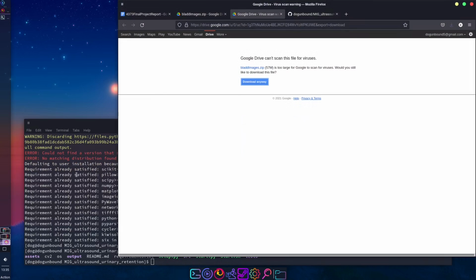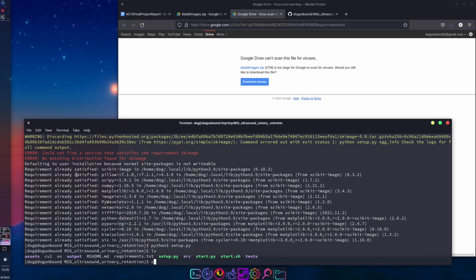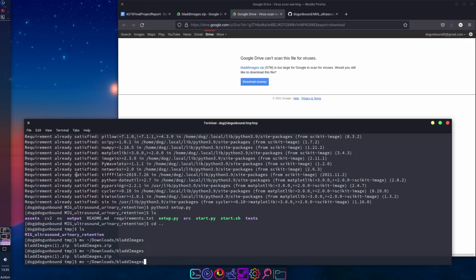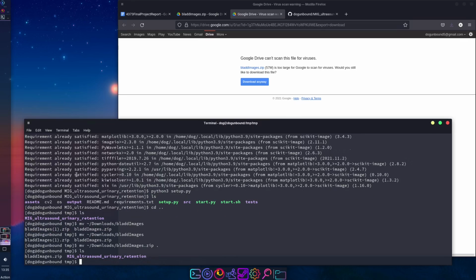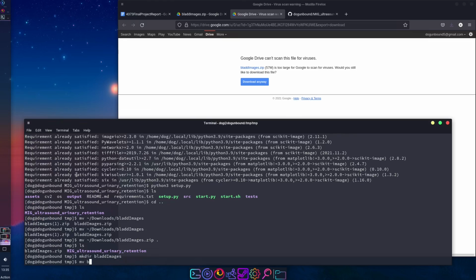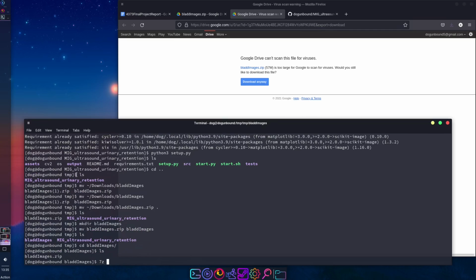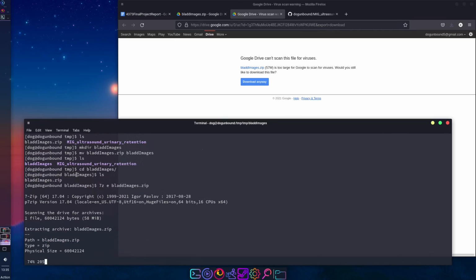So now that we've downloaded the file, let's go ahead and move it to here. I'm going to make a directory called this, and we're going to extract everything.